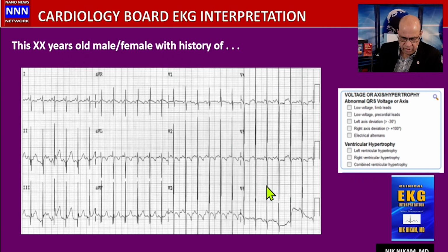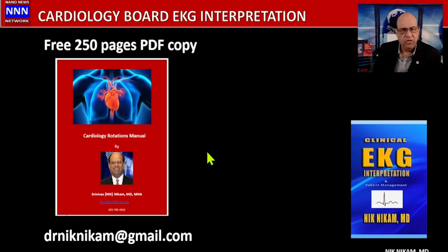left ventricular hypertrophy. Along with that, there may also be left atrial abnormality. So we are looking at combined right and left ventricular hypertrophy with strain. So ladies and gentlemen, that is a quick overview of electrical axis, how you quickly determine what segment the electrical axis is, and how to determine whether we're dealing with a right ventricular hypertrophy or left ventricular hypertrophy or biventricular hypertrophy.